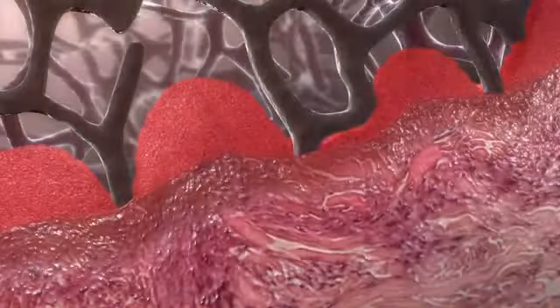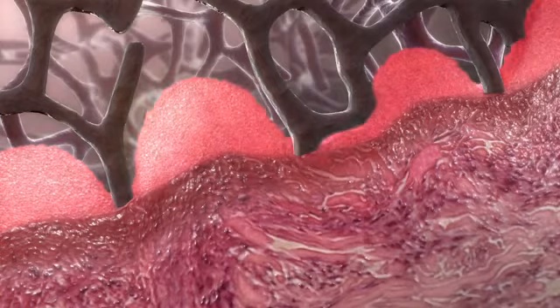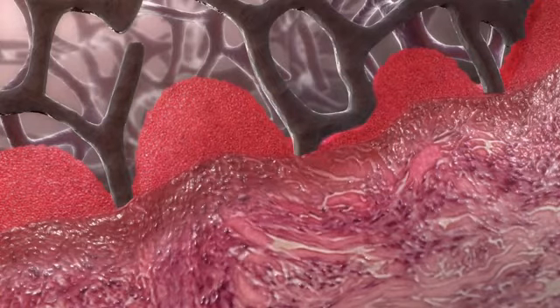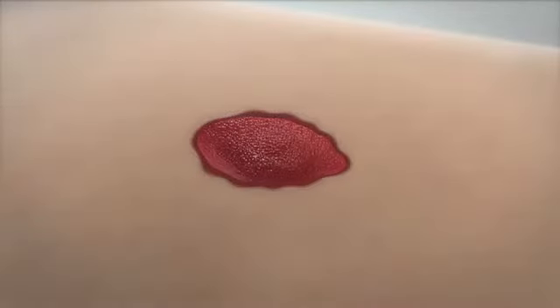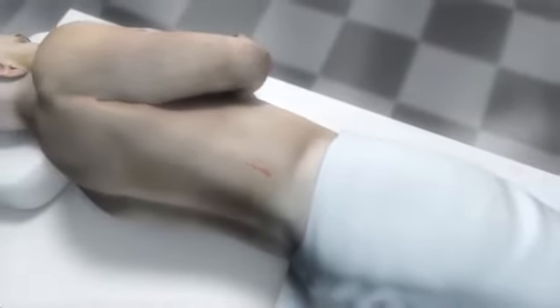All of this cellular activity leads to the formation of healthy granulation tissue in the wound bed and the characteristic undulations that have been seen in wounds treated with VAC therapy. Over subsequent dressing changes, the granulation tissue fills the wound bed, further reducing the volume and preparing it for final closure by secondary or delayed primary intention.